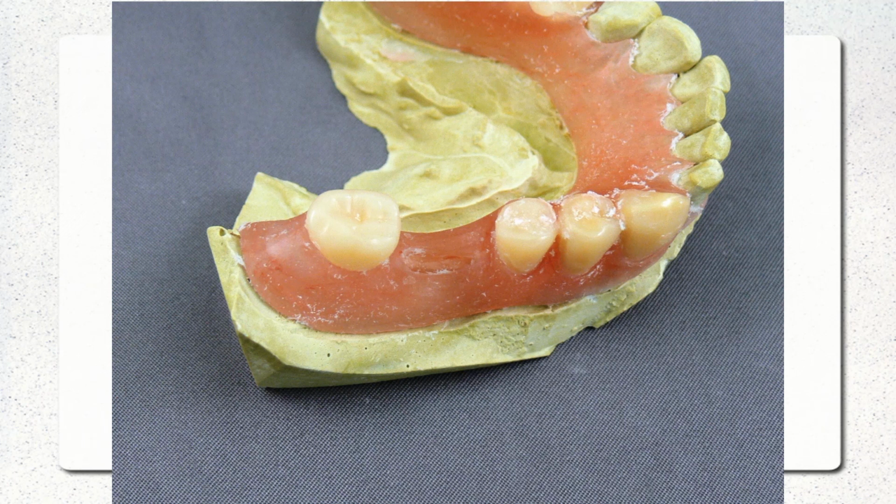The times that you're going to need to do a repair on VisiClear would be if for some reason, which I don't know that I've ever seen, a major connector breaks, or adding a clasp. That'll be a big one, really, is adding a clasp onto an existing case.